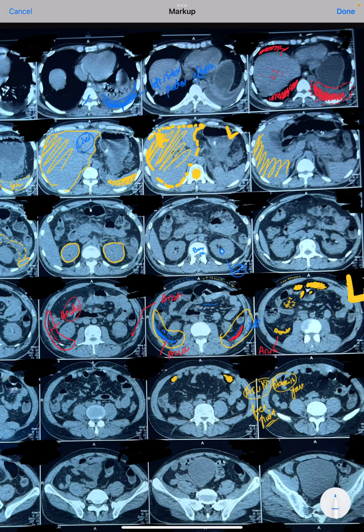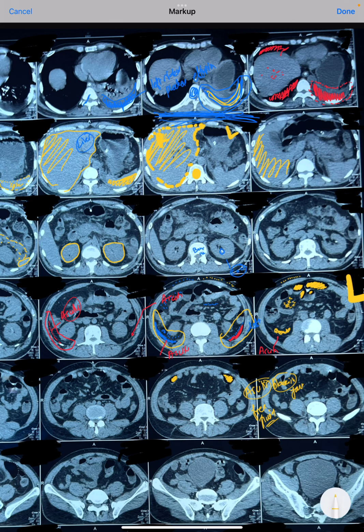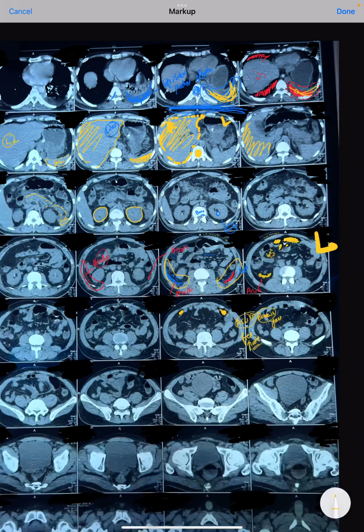And this is pleural effusion because it is on the dependent part. The patient's back is on this side, so the patient is lying down. These are the vertebrae, so the patient is lying on this. It means this is the dependent part, and this free fluid has taken a concave shape around the rib margin, around the lung margin. So it means it is pleural effusion.